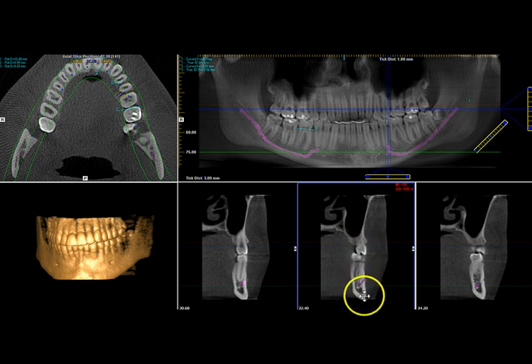Pardon. And let's look at the cortical bone, 650, 639. And the trabecular bone in the middle is about 200, 300, and even the cortical bone changes as you move along. It could be more porous in the maxilla versus the mandible, and even contrast can give you an idea. But it's a good way. So if you have more of this cortical bone, it can tell you it's a denser bone. That's the quality of the bone. It's a denser quality of bone.